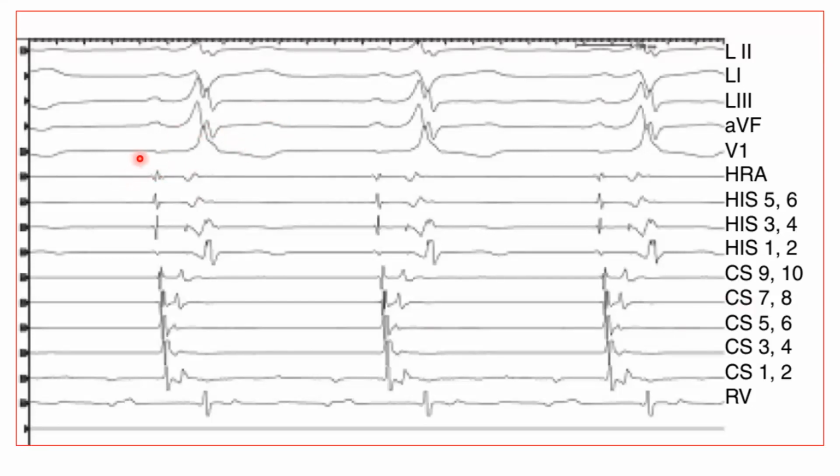We'll go back to the surface view. We are seeing the ECG showing wide QRS complex. So most likely this patient has pre-excitation. If you have a short HV interval, the first thing that comes to mind is pre-excitation. Or if you have a V without H, also pre-excitation, because the activity comes from the atrium to the ventricle without passing through the AV node.